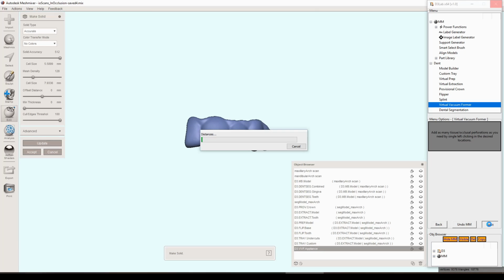And we chose 1.5 millimeters, so this little matrix will be 1.5 millimeters, which should be sufficient to 3D print with the indirect bonding tray material. You'd want to have the supports on the outside of this, so the inside wouldn't be affected by removing the supports at all.